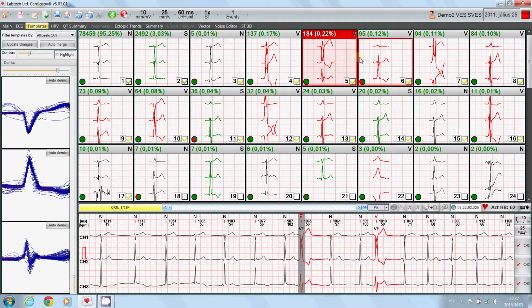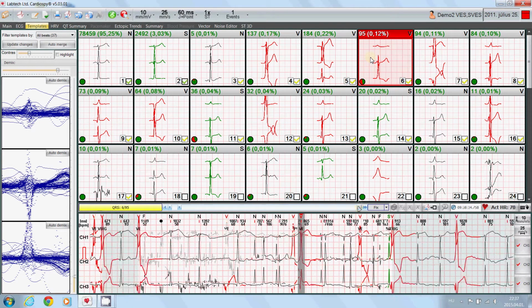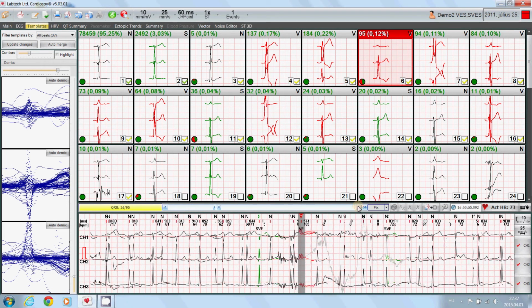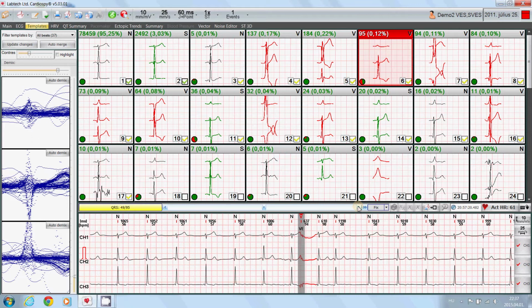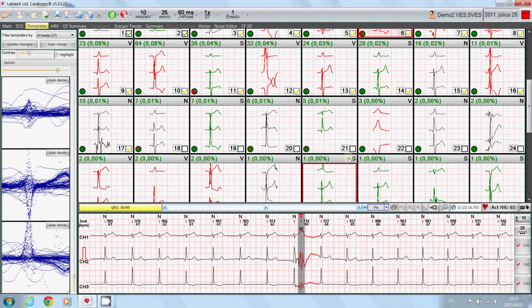The fifth one looks okay. Just like the sixth, which is mostly okay, however it contains lots of noisy beats, which normally you would want to fix, but I will not do it in this case, because I've already shown you how to do this. I will just skip the other templates and get to those with a very small number of beats.